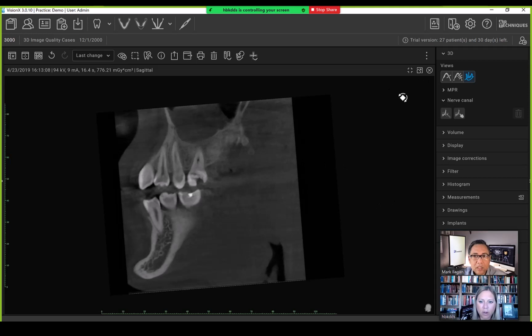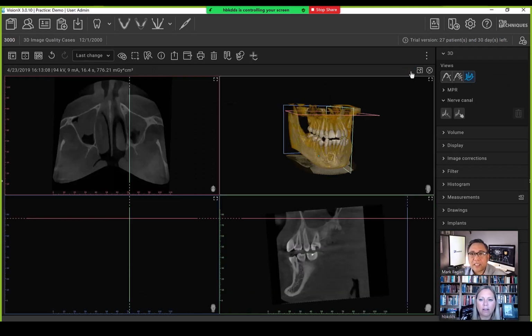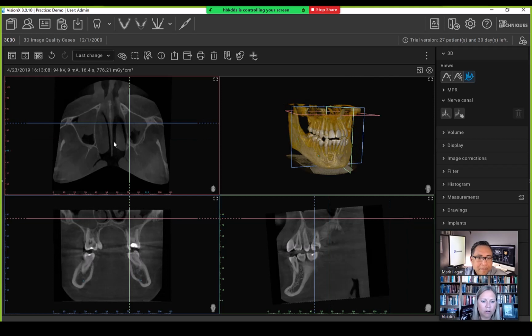And how do we make it smaller again? That first icon on the top corner there. You had it. You're in the right side. Right. Okay. This guy. Go to the left. There you go. Yeah. All right. Cool. Super easy software. Yep. All right. I don't know my crosshairs one.